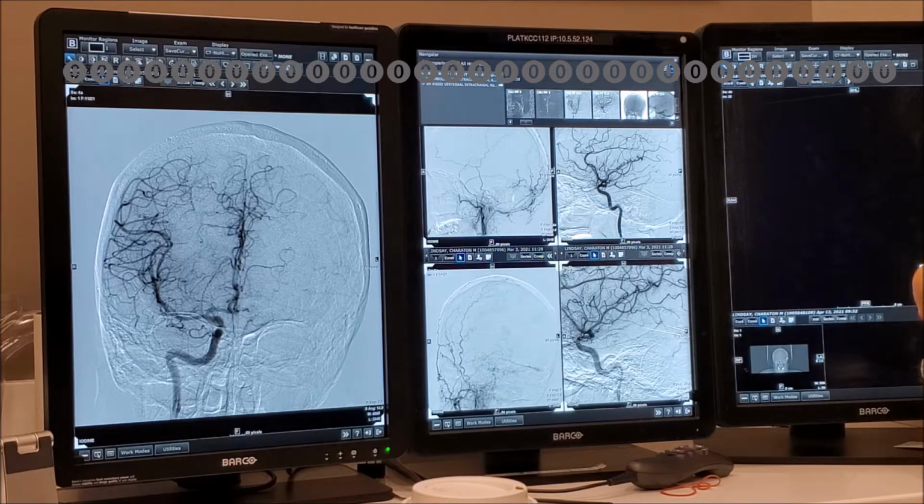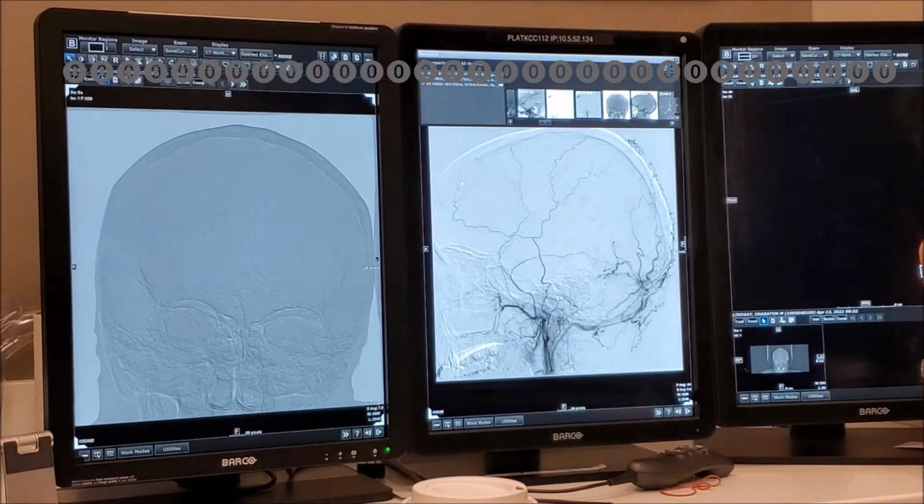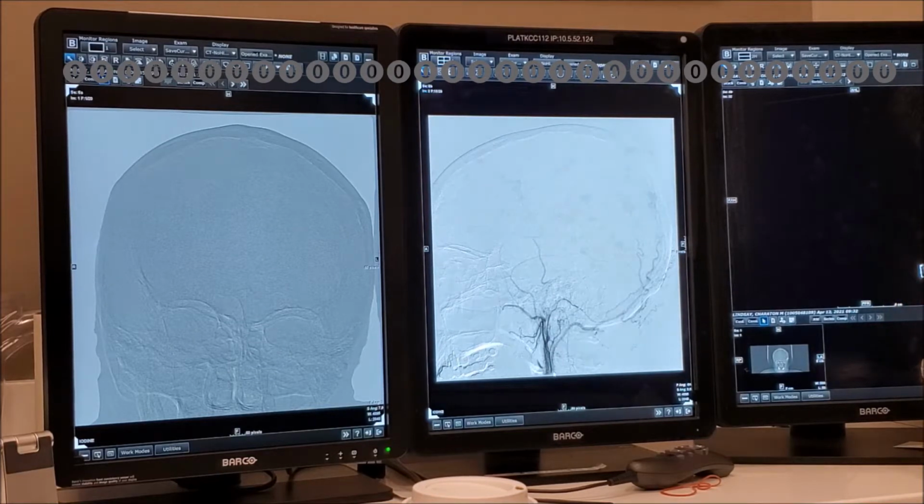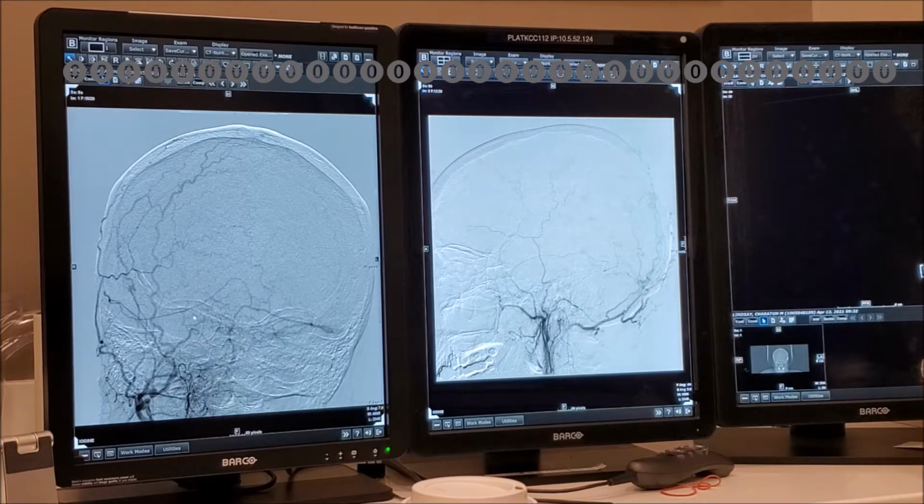Now, obviously, this other picture is also very interesting, right? And this comes to our rules when we see a vessel reaching the midline, right? Can you tell me what is the blood supply that is abnormal here? I mean, we know something's going on across the midline, right? Yep. Bingo. So what artery, can you identify the artery? What's this one? That's the occipital artery.